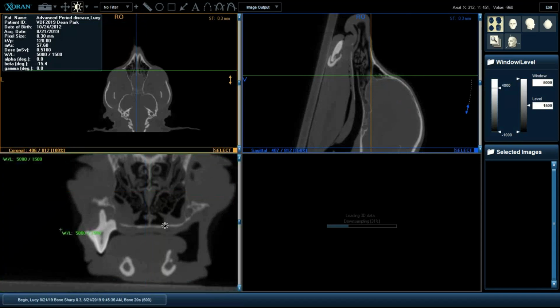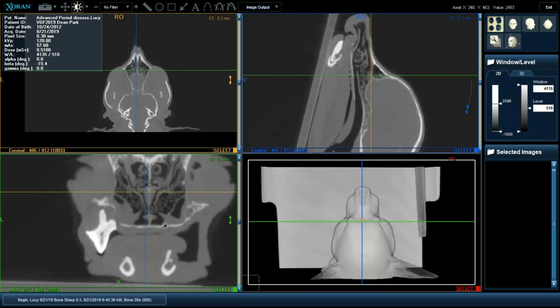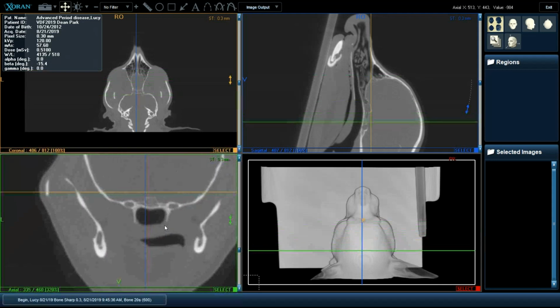And by the way, it's relatively easy to change the contrast. So I'm adjusting that so you can see how it works. But here is a tool that basically shows soft tissue. Mostly there's very little bone attachment remaining. So here's a very severe case. Of course, a lot of extractions already.